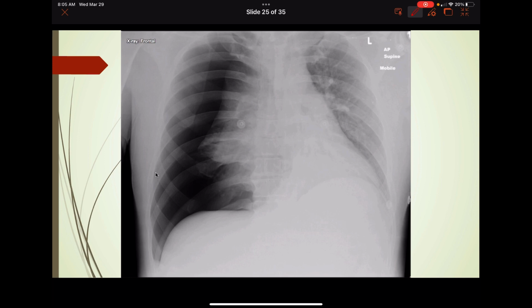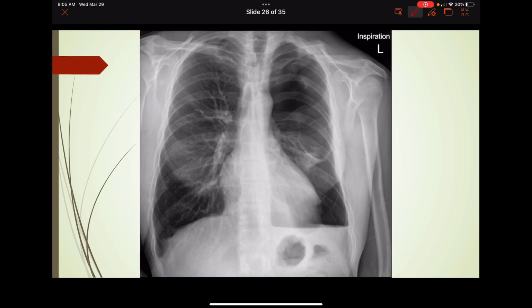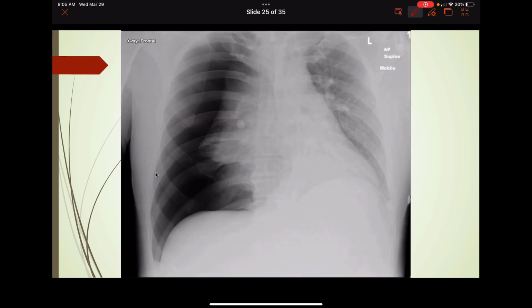And another, looking for the trachea here, but it's a bit underexposed. You can't really see much. I don't see really anything there. So B for bones, what you can see, I don't see much fractures there. And cardiac silhouette, here's the silhouette. You can't really see anything here on the patient's right side.